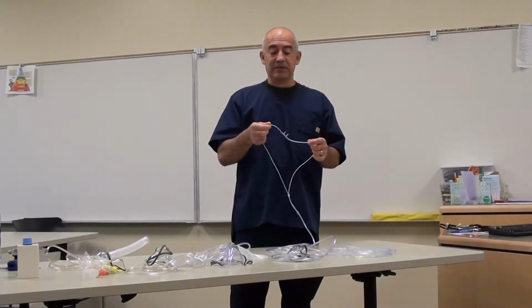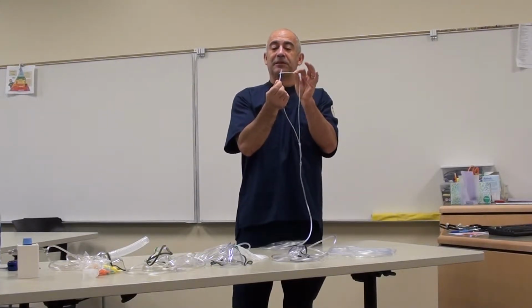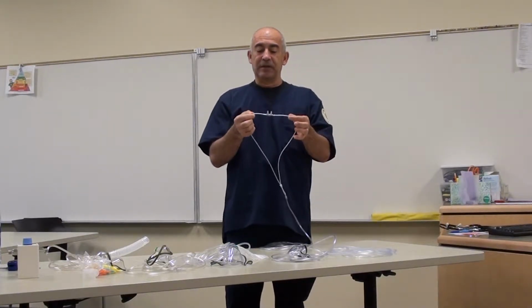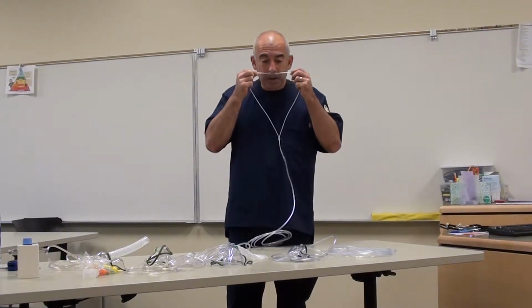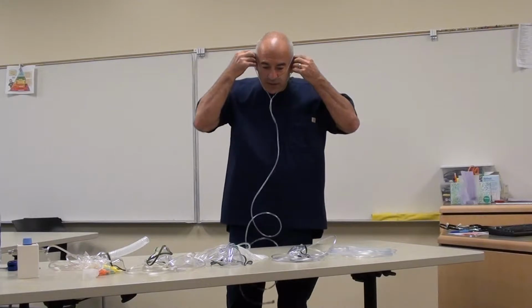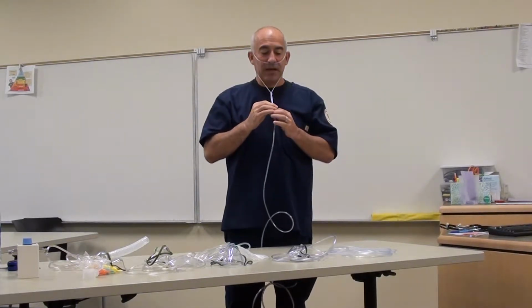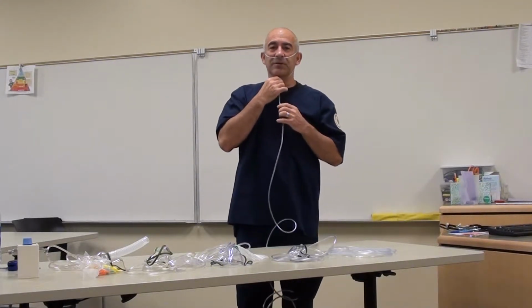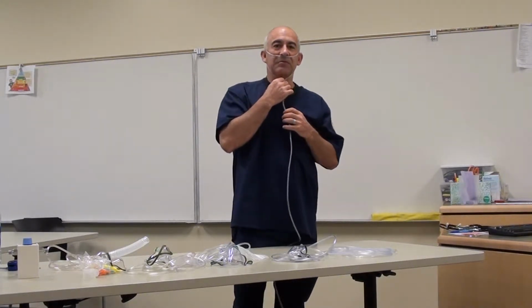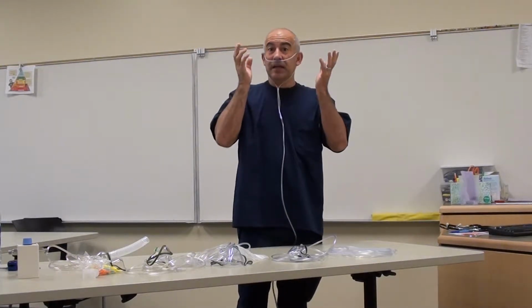The way you put this device on, you can see that there are a couple of prongs where the oxygen is delivered and that they're curved. You want to make sure that the curve points down towards the lungs. I'm going to demonstrate putting it on myself. I'm going to show you how easy it is. You secure it by taking the tubing around the ears and using this little sliding collar up here to secure it in place. You don't want to do it too tightly because you want the patient to be comfortable, but if it's too loose, then it could become dislodged and unstable.